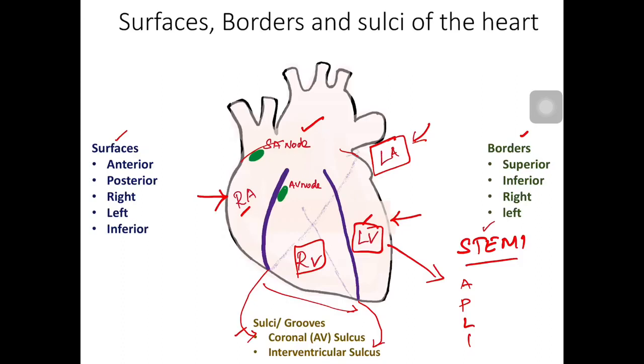That's one issue, and atrial infarctions are not going to be seen in the ST segment elevation. They are picked up from the atrial ST segment, also called STa, which actually falls in the PR segment. So when we look at the ST segment, it's only the ventricular infarction, and that too mainly the left ventricle infarction.